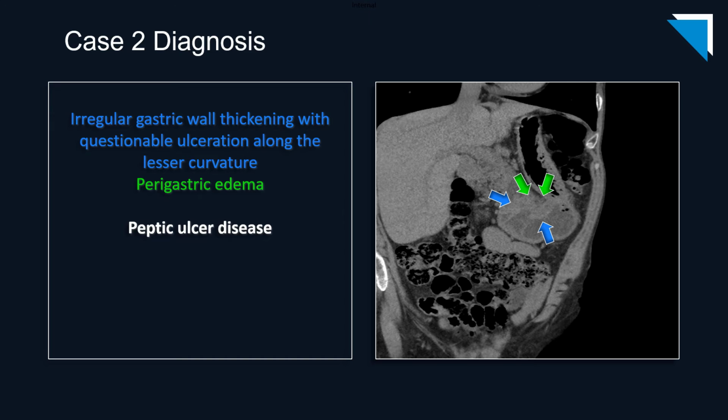I wanted to show it because I feel like this is an area that is under-scrutinized by radiologists. We see quite a bit of missed pathology in the stomach because when we run the bowel, we tend to focus more on the small bowel and the colon, the appendix. But I think it's very important to include this in your search pattern, and I always advocate for people to scrutinize the stomach, particularly the gastric antrum, so we don't miss pathology like this.